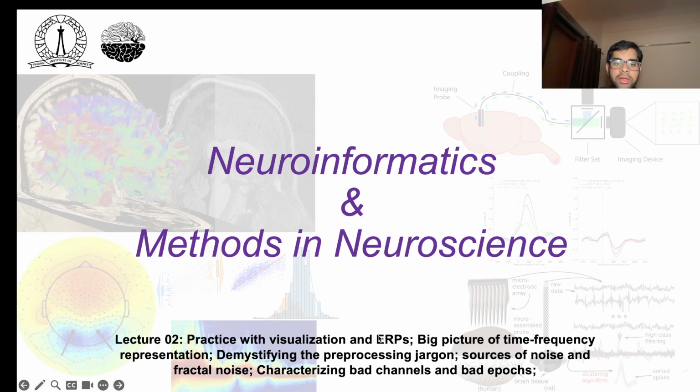So today we are going to have a bit of practice with real data for visualizations and plotting ERPs, and we will get an intuitive picture of what is meant by time frequency representation of a signal.